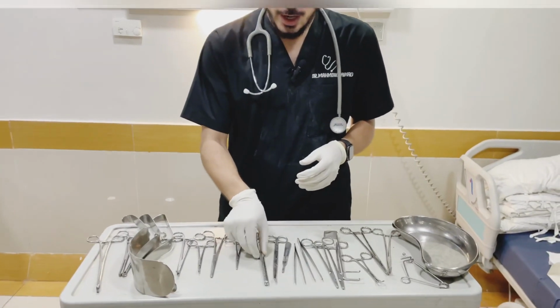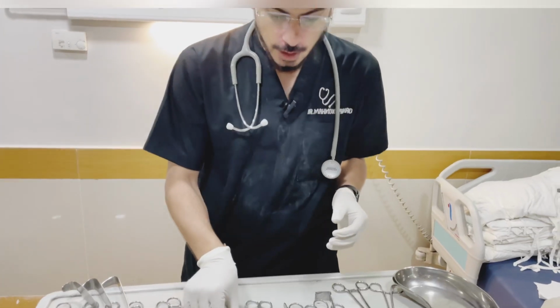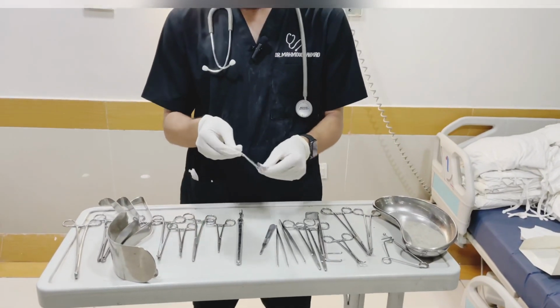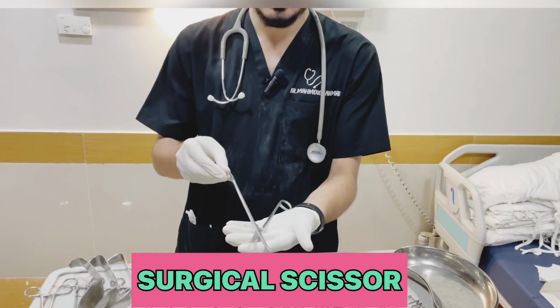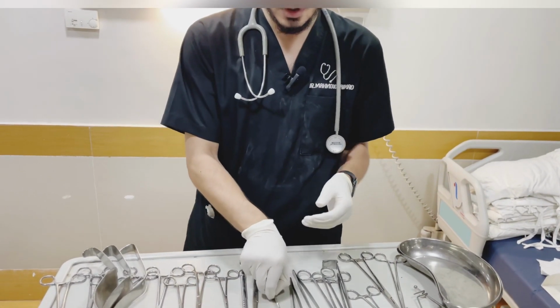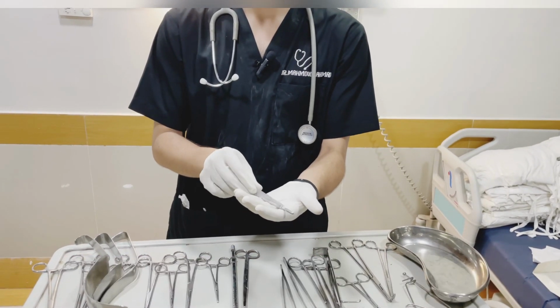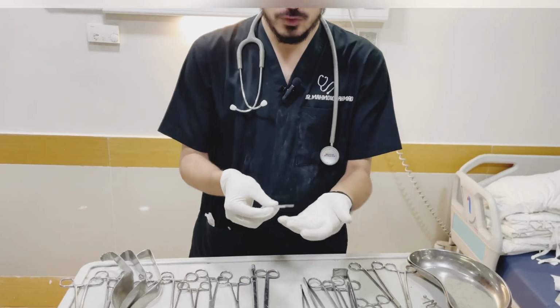Now this is known as pool suction. It is usually used to clear the secretions. Now this is known as scissor. This is a simple scissor. Usually it is used for cutting various tissues. And this is known as BP handle. It is also known as incisional handle, as it is used for the incision.